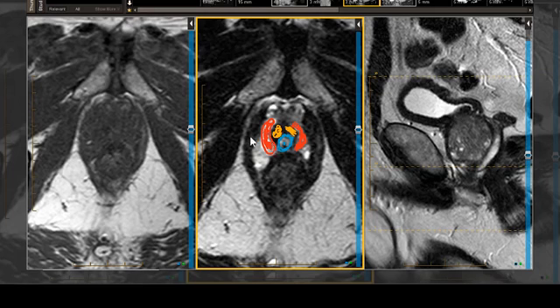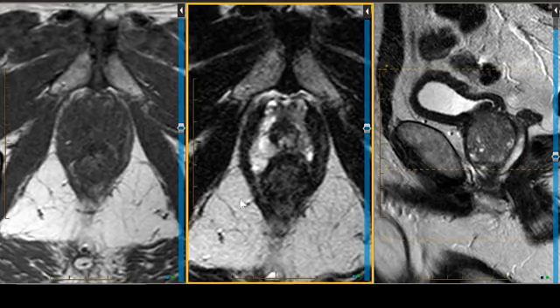And there's your levator sling and some periprostatic fat down low with your rectum behind. Now let's work our way up to the prostate base. So we're going to go up to the base. Now when you're describing these zones, you're going to say PZA base, PZA apex. So not only are you going to say right versus left, not only are you going to say PZA, PZP, PZM, but you're going to say base, up high, mid, in the middle, apical, down low.